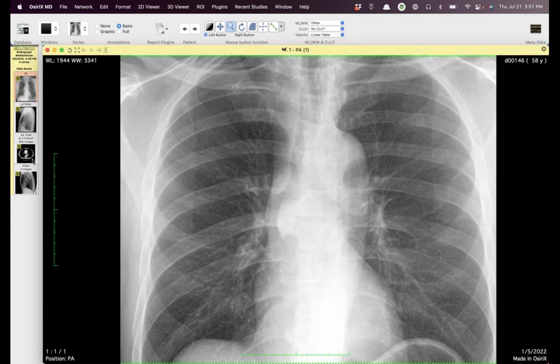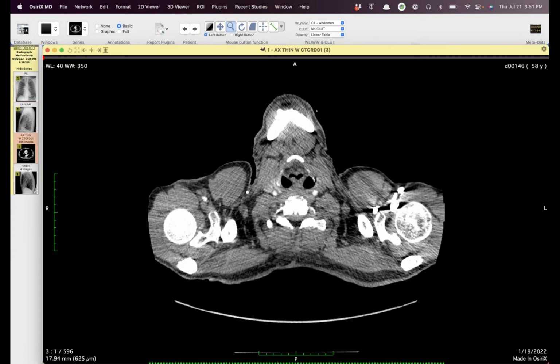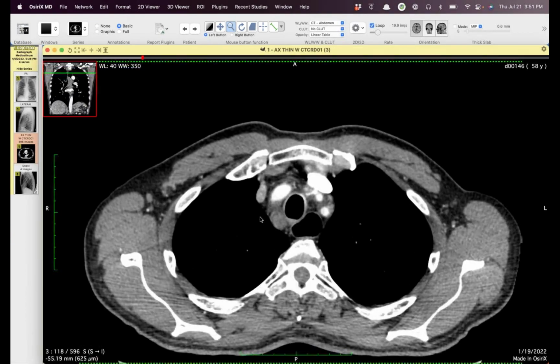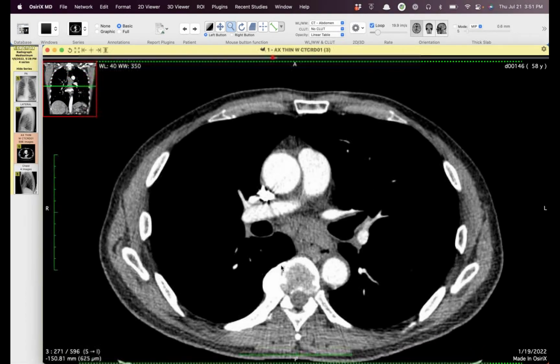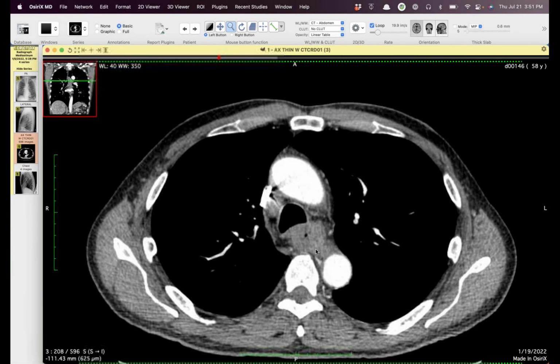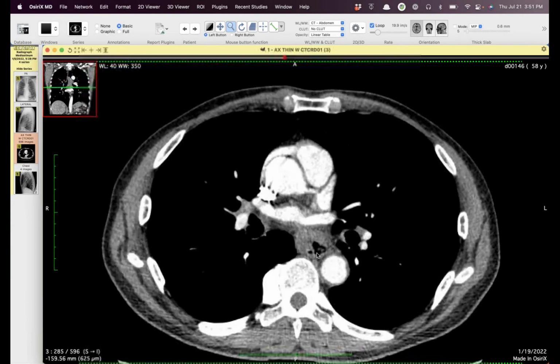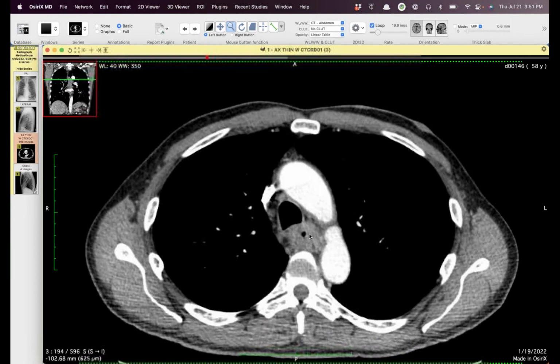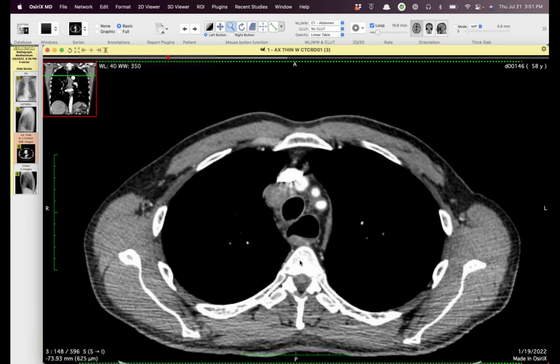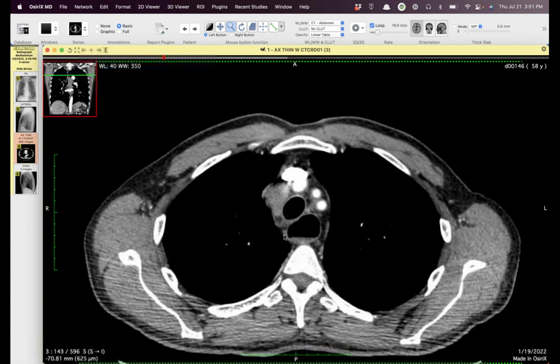And you'll see on the CT, which was done shortly after that radiograph, that first of all, there's a big osteophyte here, but there is a huge esophageal mass. Just a circumferential esophageal mass that spans almost 7-8 centimeters, and it did turn out to be esophageal cancer.